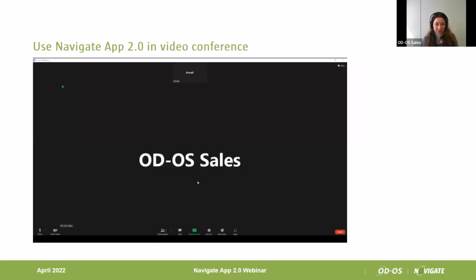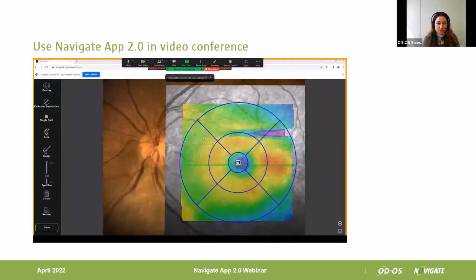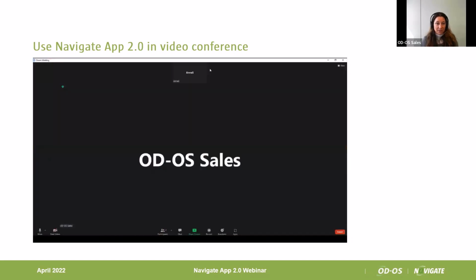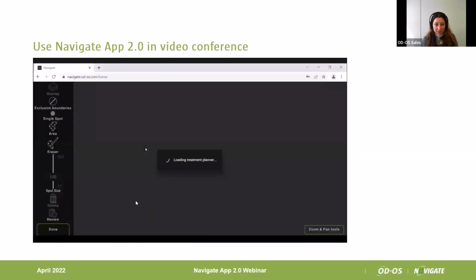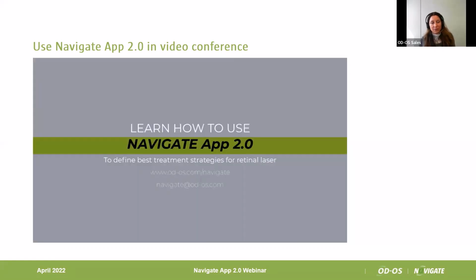So now it's time for your video conference. All your participants do have the course database on their own Navigate app. You as a teacher have it open, for example, in your browser, and you could easily just share the screen as you would do with any presentation you hold. And now didactically, you can just decide what you want to give as information for your students. You can introduce the cases. You can also immediately hand over the control to your student. They can share their app screen, show their solutions, so whatever you prefer. And this way you can hold a real interactive online course.